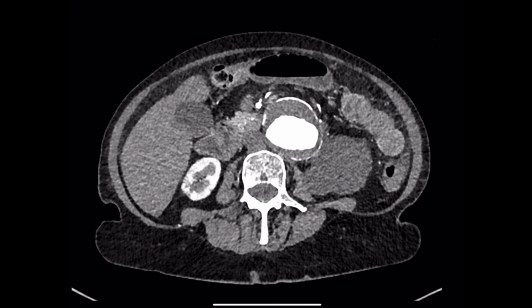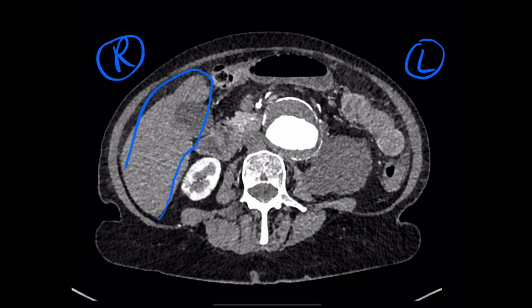Okay, maybe a little bit of quick normal anatomy. It's a single slice of this axial scan, with the patient's left and right as shown. You've got liver. We've got a little bit of right kidney peeping in. This is probably a cyst at the lower pole of the left kidney that we've partially included. We've got a bit of colon here, and black means air. A little bit of colon here because you can see the poo, that mottled look to it.